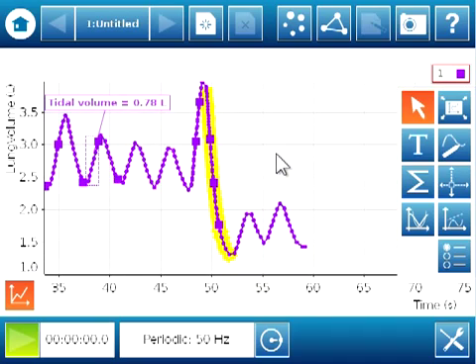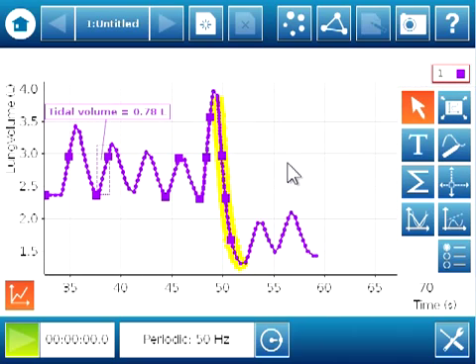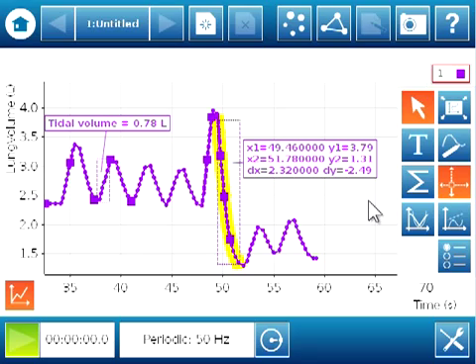So you can see that I've selected the maximum exhalation, emptying the lungs again of as much air as I possibly could. Applying the Coordinates tools to that, I see the difference in y, or the change in lung volume, was 2.49 liters. As I did before, I'll annotate the graph so I can preserve this value for future reference.